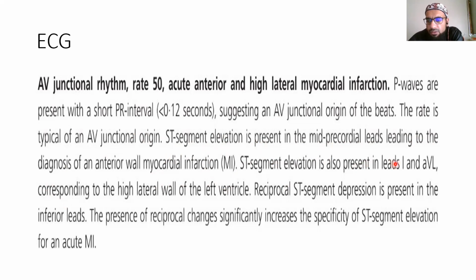ST segment elevation is also present in leads 1 and AVL, corresponding to the high left lateral wall of the ventricle. Reciprocal ST depression is present in inferior leads. The presence of reciprocal changes significantly increases the specificity of ST segment elevation for acute MI. And in our setting, that's as far as we take it.